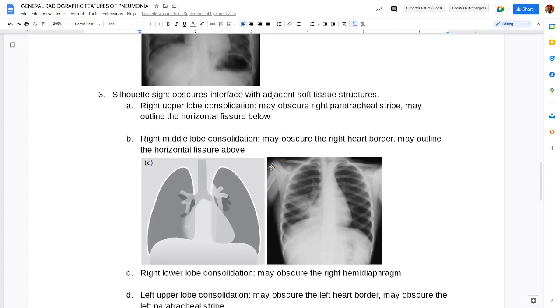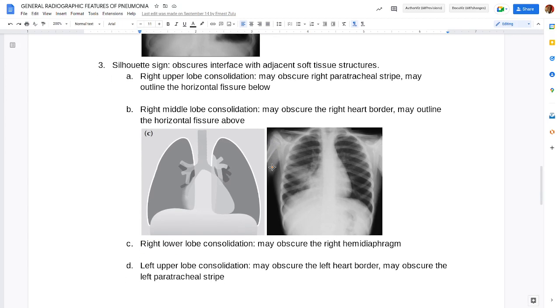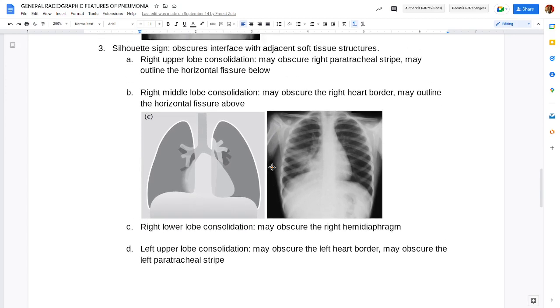Remember, when we talk about the pathology, what really happens in a pneumonia is that the air spaces fill up with material other than air, which makes the lung in that region more dense, so it absorbs more x-rays. In the area where the pneumonia is sitting, the image will not look dark, it will look a bit white.